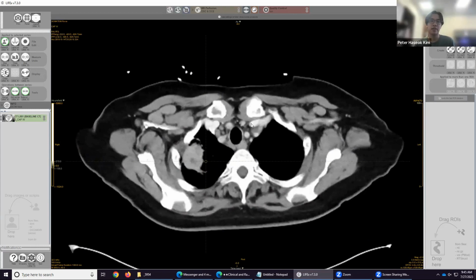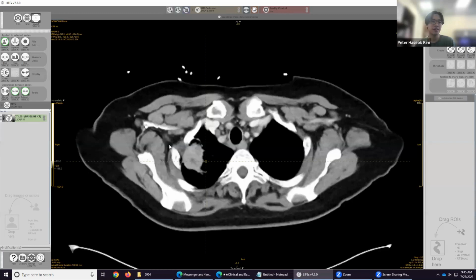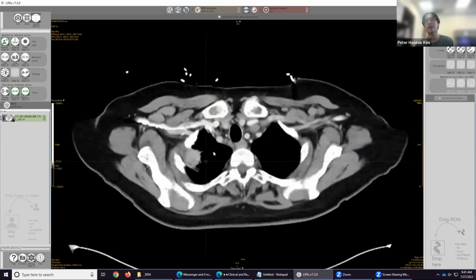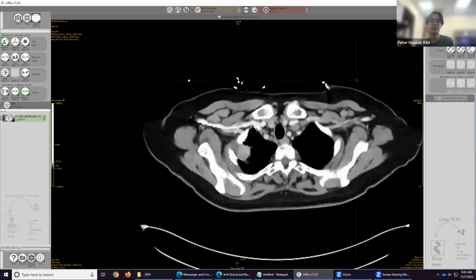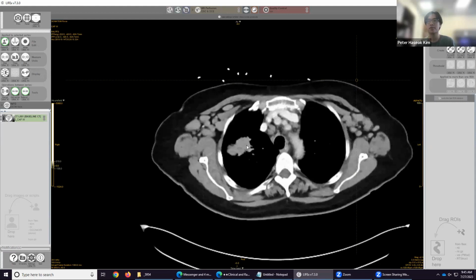And then if you press Control and you slide your mouse, then it will shift whatever segmentations you've done to the next slide. Sliding left will do something, sliding right will shift it the other direction. That's pretty important when we start segmenting, because sometimes you'll press control, zoom out, and then move your mouse, and that'll shift all of your segmentations. And so you don't have to redo it. You just need to shift it back by pressing control and then swiping your mouse.